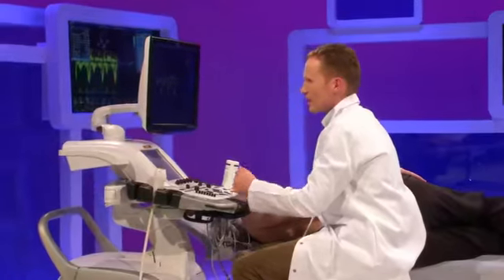So by this way, we have assessed the LV systolic function using the 2D imaging, the 3D imaging, and the Doppler to have the assessment of dimensions, diameters, and volume, to measure the global LV systolic function by the LV ejection fraction. And also, for our daily practice, nowadays, we have to report the assessment of LV longitudinal systolic function by the tissue Doppler techniques.